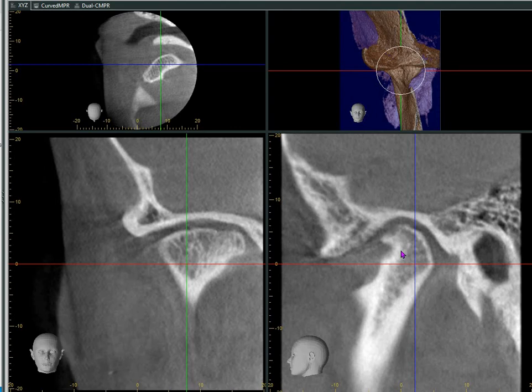As you can see, this scan shows a joint with chronic degeneration and very little cartilage remaining. The 5 mm space in this area is no longer seen, and this patient has well over 80% damage to the joint.